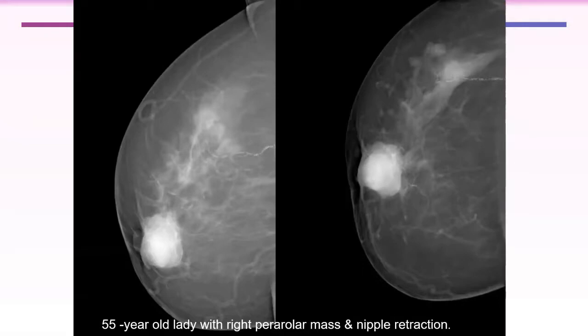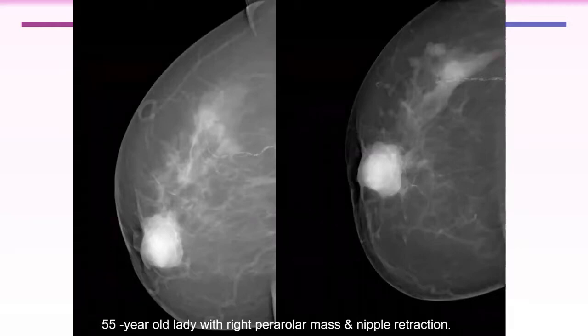We missed one hour, Medina. Would like to compensate. Is there any other abnormality? There is vascular calcification in the lateral part of the breast. Okay, it might be diabetic, or atherosclerotic changes. No abnormal lymph nodes. No other lesion.